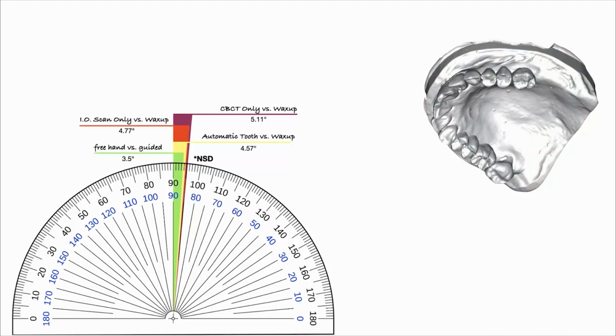And I'll describe in detail the process to make a full diagnostic digital wax up happen. So we looked at those. And if you look at a lot of practitioners with a lot of digital planning experience, just planning digital implants based on those 4 parameters, look at the scatter, the deviation in possible implant position. So that's all of the implants.